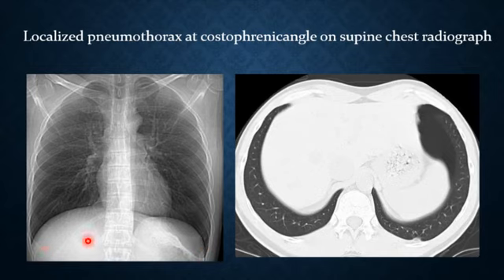For the first look you might say it's normal, but if you look carefully, this is much sharper and deeper than this one. And when they did a CT scan, you can see the pneumothorax here. Any question, anything, any comment?